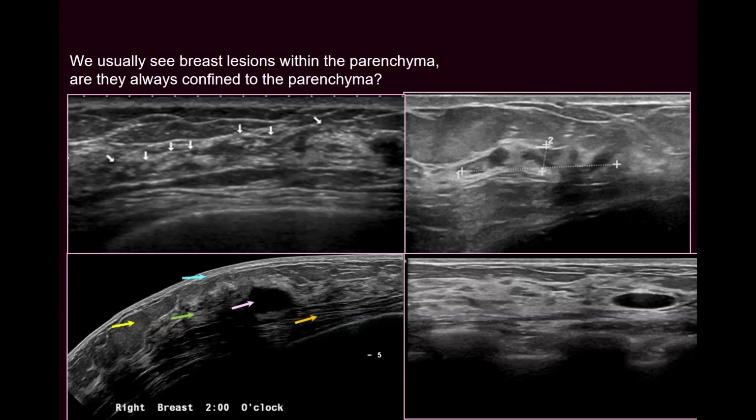Or do we only expect to see lesions within the mammary zone if we have a non-involuted glandular breast? Just the mammary zone. You cannot see it outside because the breast is enclosed, unless there is interruption of the superficial fascia. With no interruption of the superficial fascia, the lesion is enclosed in the mammary zone.